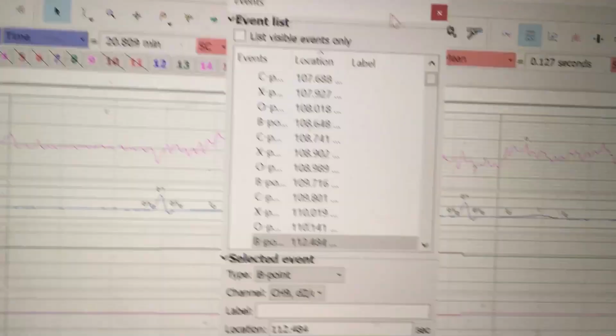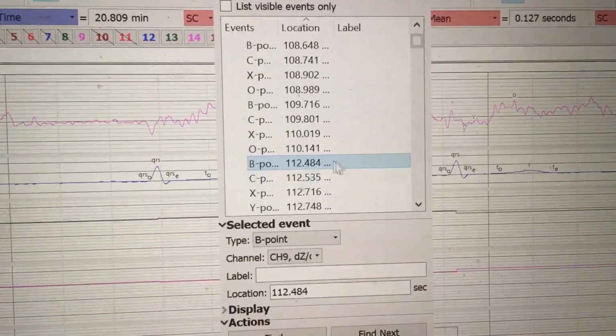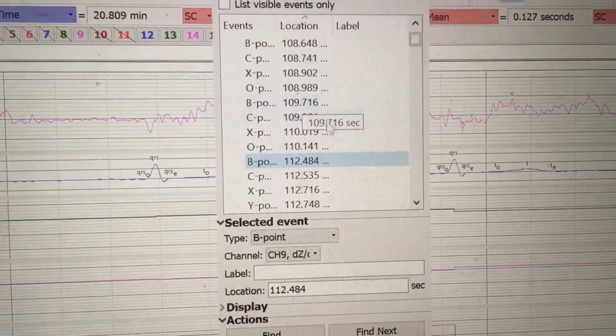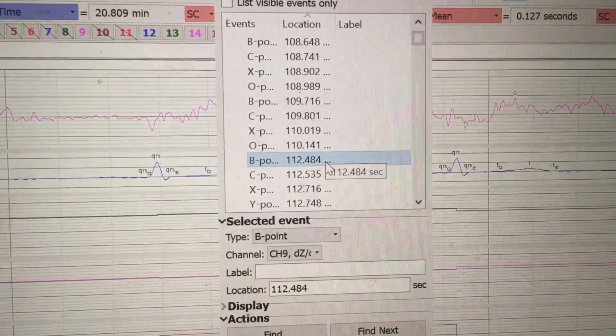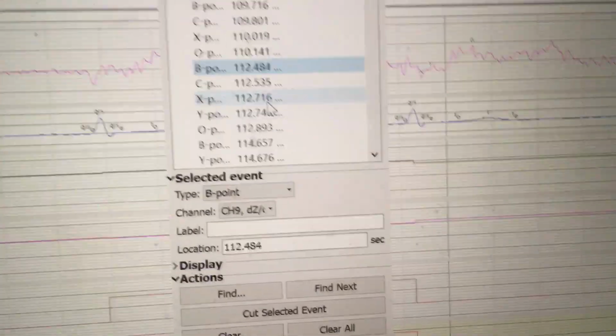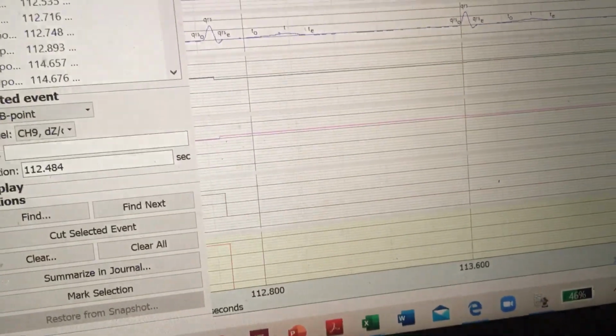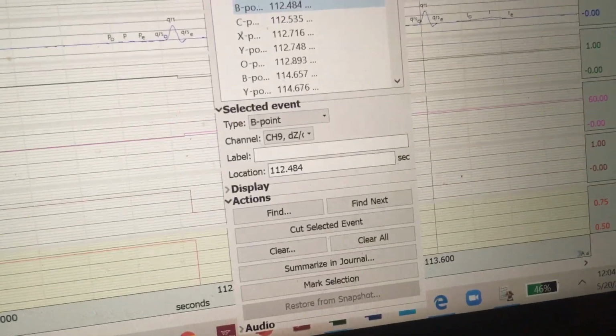So bring this over here, and I'm going to look. I'm assuming I'm finding a B that's a little bit off. Really, the B's don't look bad. So I'm a little confused about why that PEP went so extremely crazy.